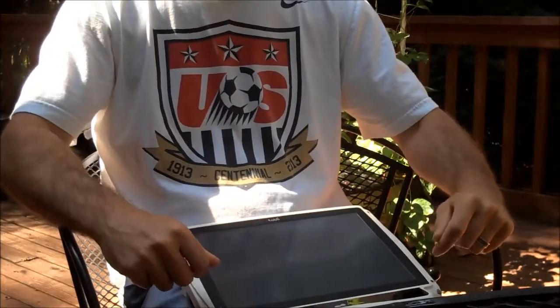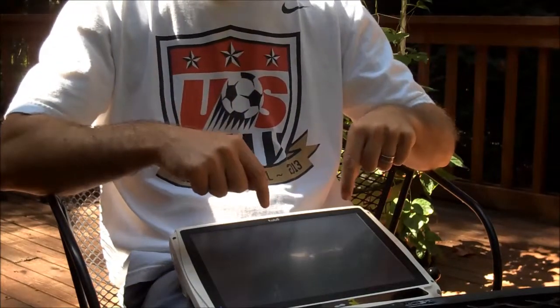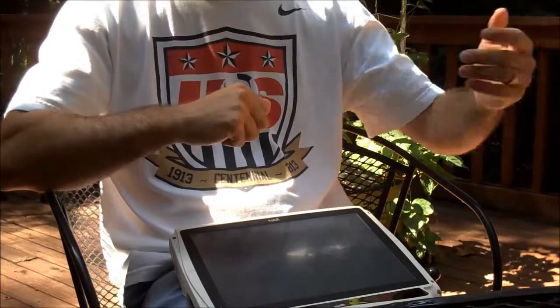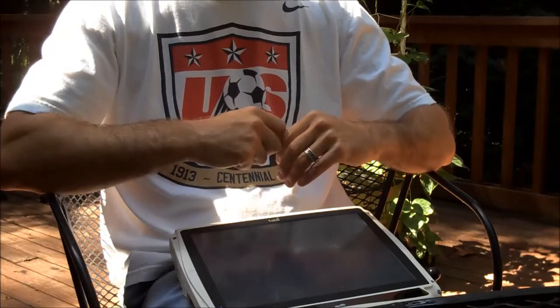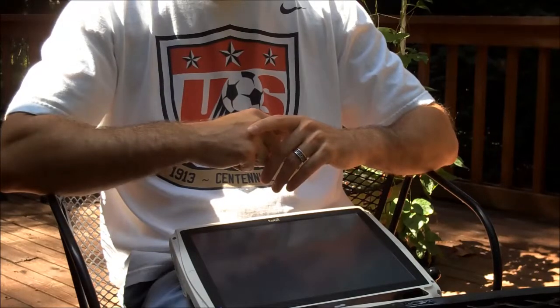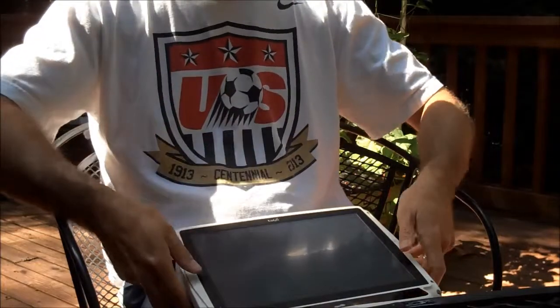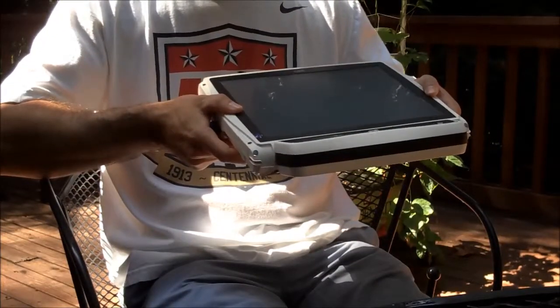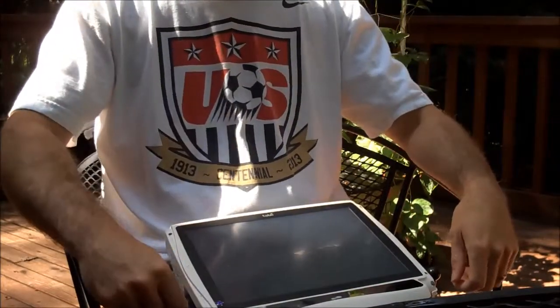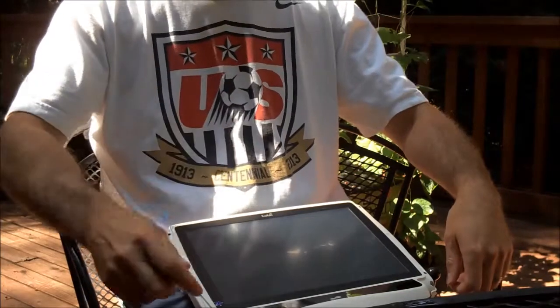Now, for me, the time I had to sit down and make edits to Jay's page sets tended to be times when Jay needed the device the most. So Jay would be in school, or in speech therapy or at a communication playgroup. And that's when I had downtime where I could make edits. So I didn't want to send Jay to school without the Tobii. So I fell into that second workflow where I would do all the changes on my laptop and copy them over to Jay's device.